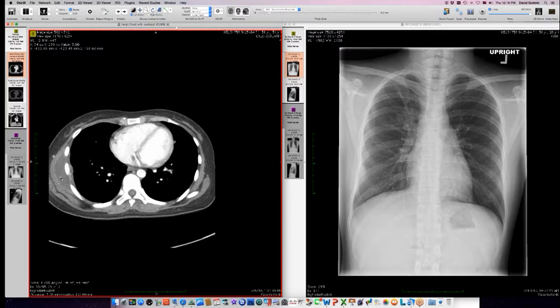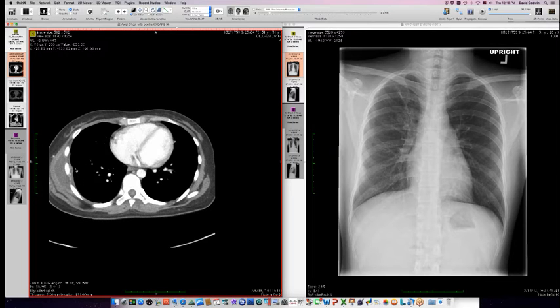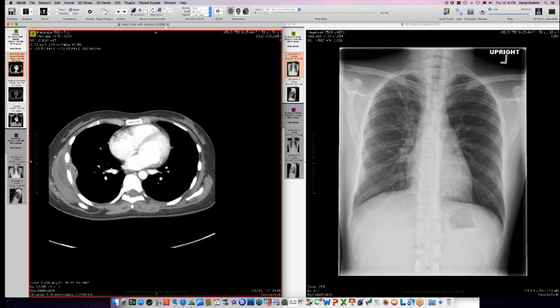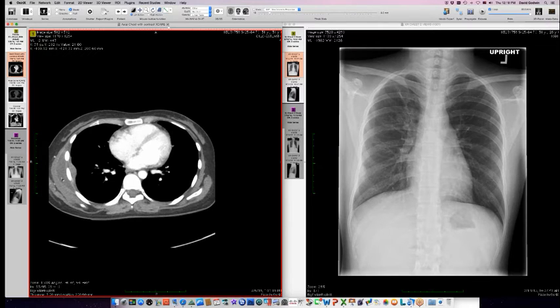So they tried to do a percutaneous needle drainage of this fluid collection, and it was unrevealing, so she eventually had incision and drainage. They scraped the inside of this lesion here, placed some drains, and then PCR identified Mycobacterium tuberculosis. So here's a case of latent TB that sprang back to life. Probably this pleural focus here adjacent to it broke down, and organisms got farther in the pleural space and then into the chest wall. So this is spread of TB with this chest wall abscess.